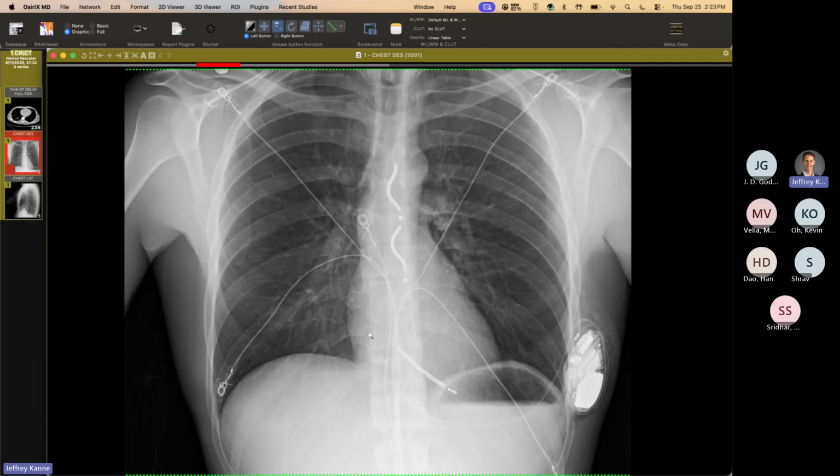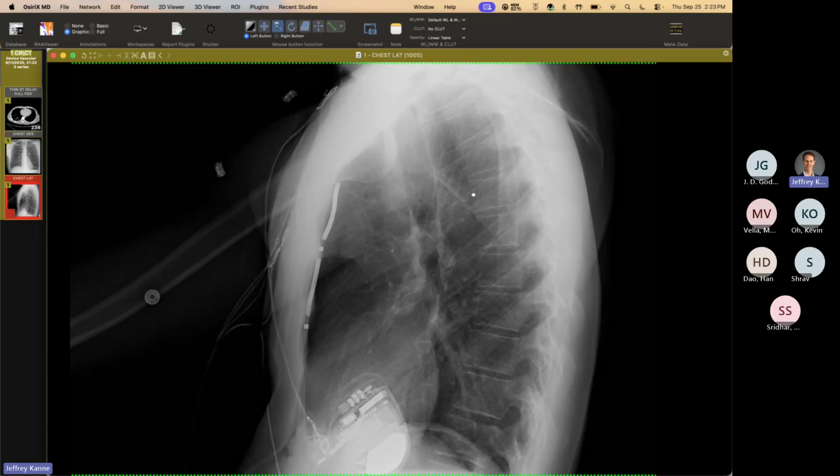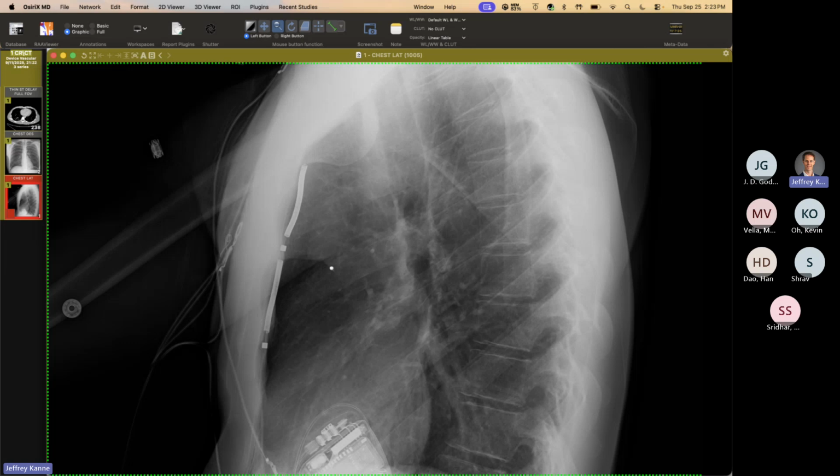You can see there's a remnant of the transvenous lead here. They got the shock coil, the sensing electrode. And so they had to cut this because they were unable to remove it. And what was interesting is these calcifications here, which we just thought were probably related to old histoplasmosis. We see these all the time, some calcified hilar nodes.